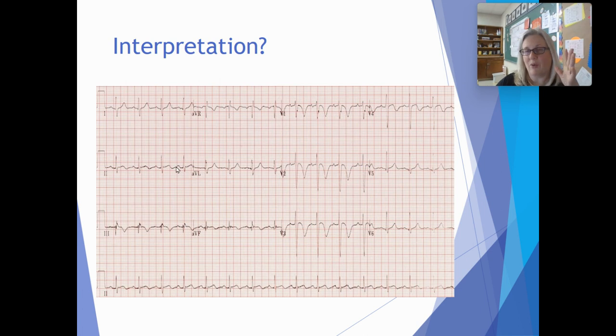So this checks out as a pulmonary embolism. And what gives it away the most is these three here, the S1, Q3, T3, but also that he has these deep T wave inversions in V1, 2, and 3. This almost gives it away that it's a pulmonary embolism. All right? All right, that's what I have for you today. That is it, my friends.